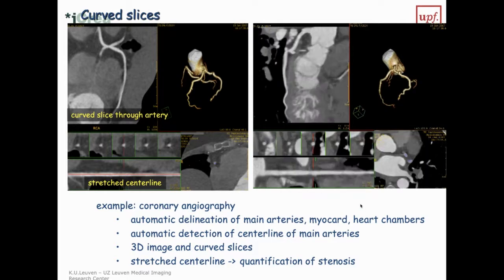Always keep in mind it's the proximal part, of course, that you do. So this is a nice interaction between, on the one hand, 3D image acquisition and then image analysis and processing in order to properly visualize the structure that you want to look for.